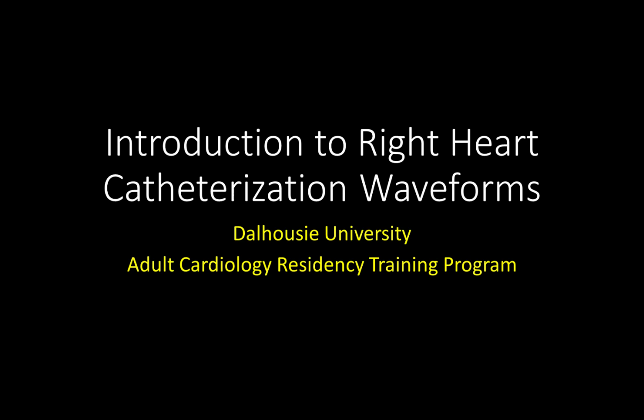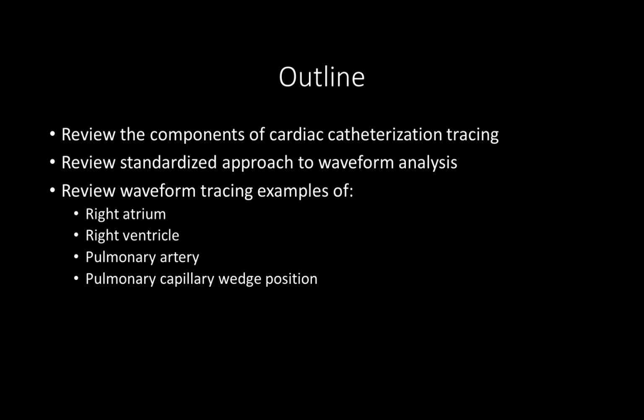Welcome to an introduction to right heart catheterization waveforms. In this module, we will review basic right heart cath waveforms. We will follow the following outline, which includes review the components of cardiac catheterization tracings, review standard approach to waveform analysis, review waveform tracing examples of the right atrium, right ventricle, pulmonary artery, and pulmonary capillary wedge position.